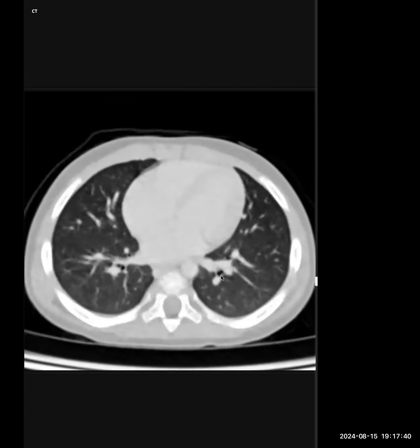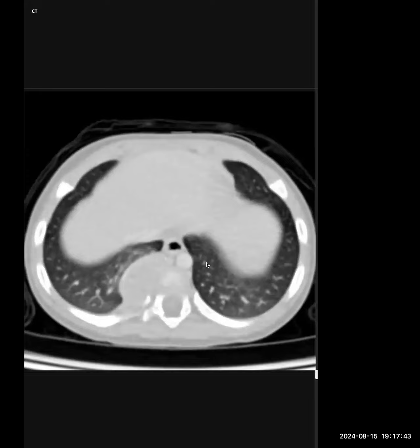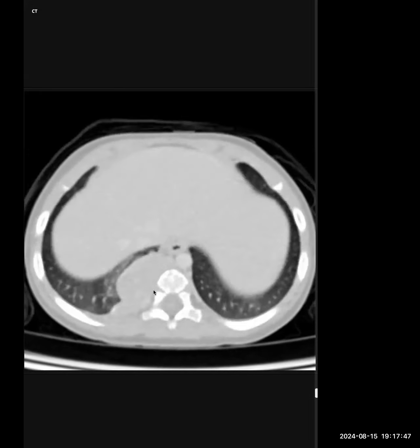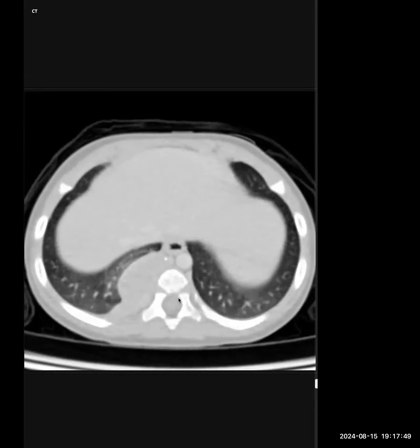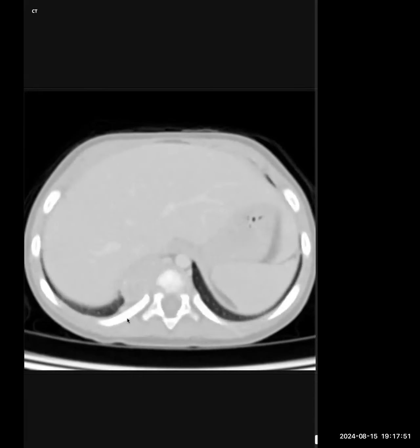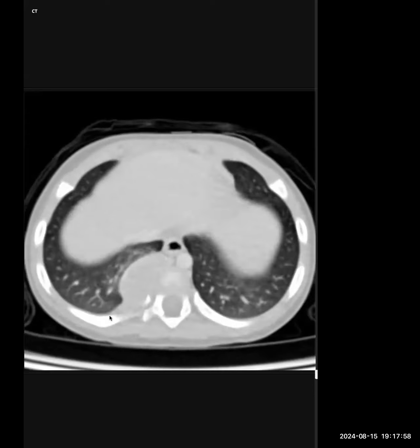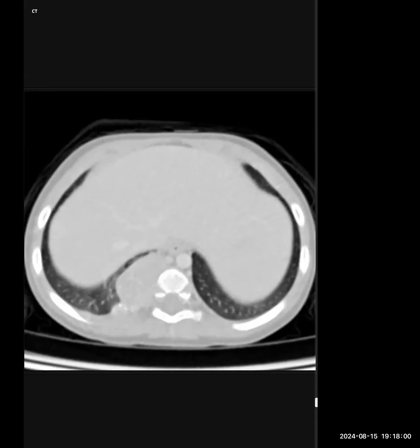And also, you asked for the mediastinal window, but before you got it, you started describing how it has extension into the neural foramina, or if it is involving the bone. I can agree with you that there is pleural involvement. You can say that, but for the bone and the neural foramina, it's better to ask for the mediastinal window and then talk about it, which you did. It's just that if you describe things in a wrong window, then it sends a wrong message to the examiner that this is what you do in practice, right?